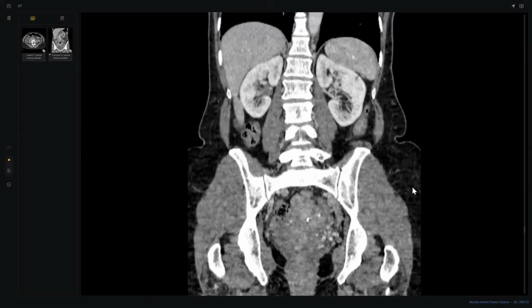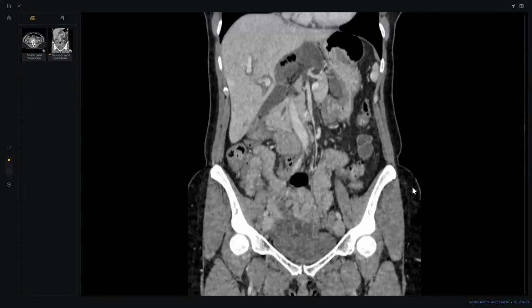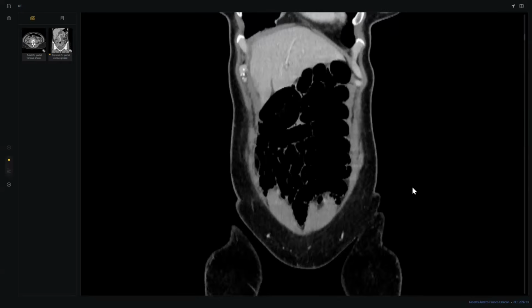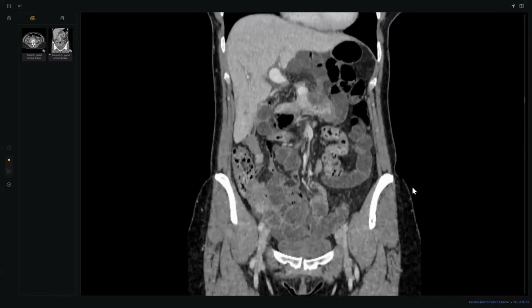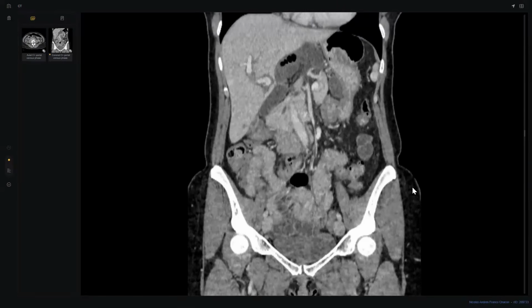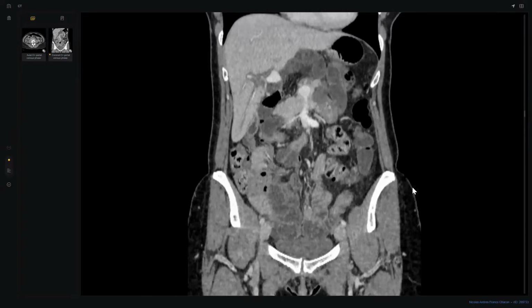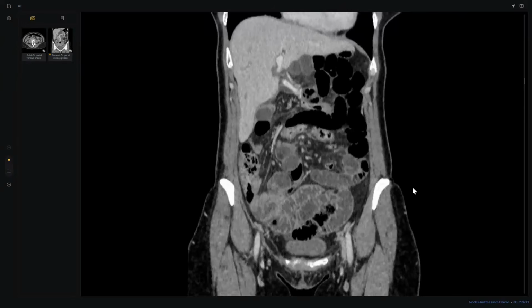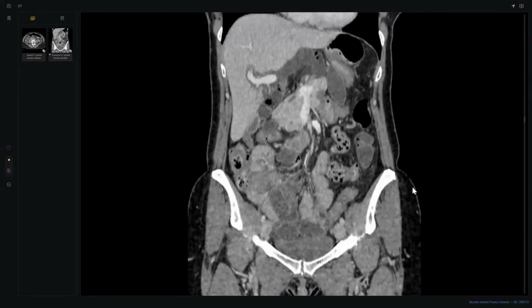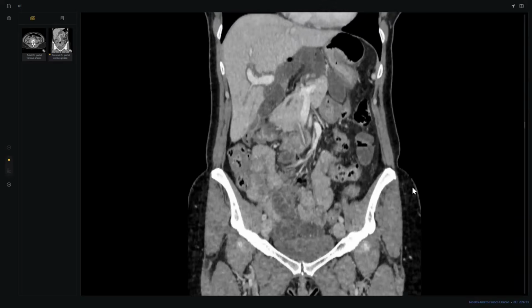I'm suspecting the bowel loops seen at the upper part of the abdomen to be part of a paraduodenal hernia, and they are relatively hypo-enhancing, with incidental hemangioma in the liver, with post-operative changes at the site of the appendix, also raising suspicion of infection if the patient has fever.